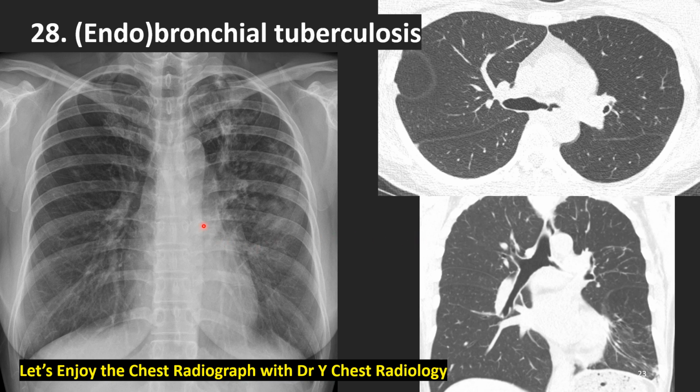How about this young woman's chest radiograph? Do you see the trachea here and right main bronchus, bronchus intermedius, right upper lobe? Yes, sure, we can. But how about left main bronchus? Do you see it well as other normal films? No, not clear here. It is somewhat narrowed, irregularly narrowed. Also with tuberculosis findings in left upper lobe. Left main bronchus is not looking good.